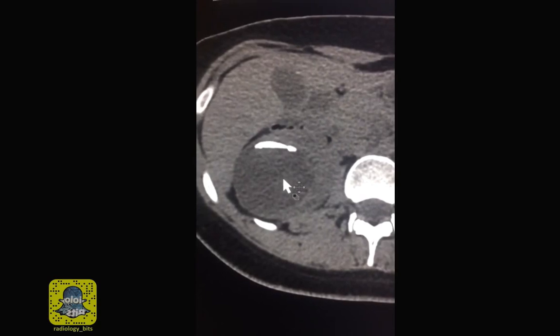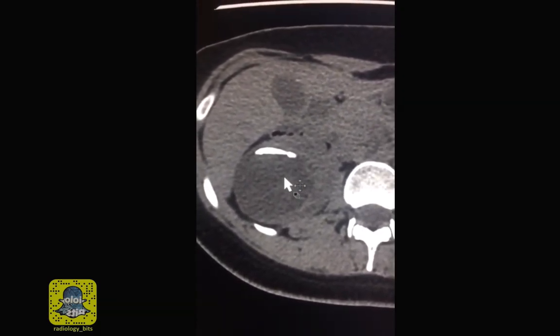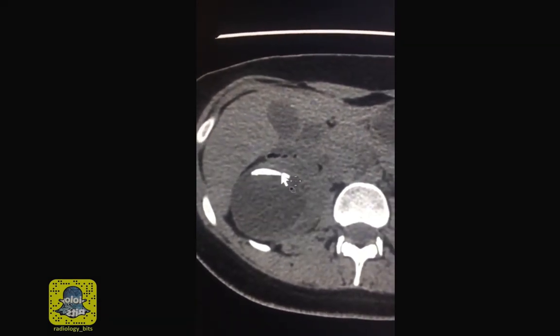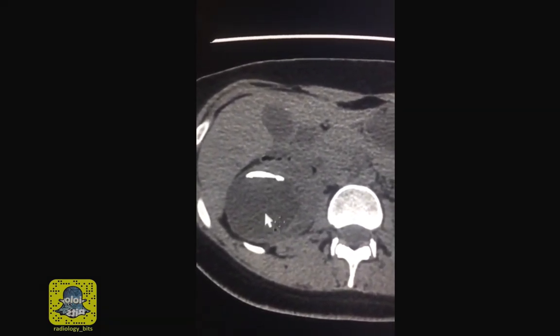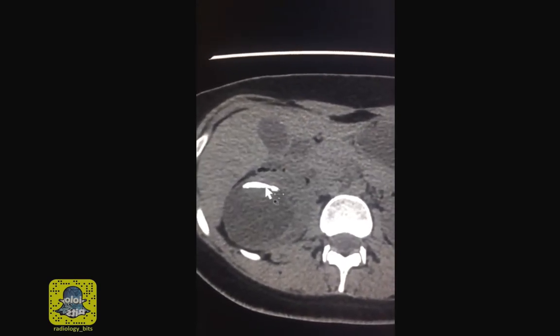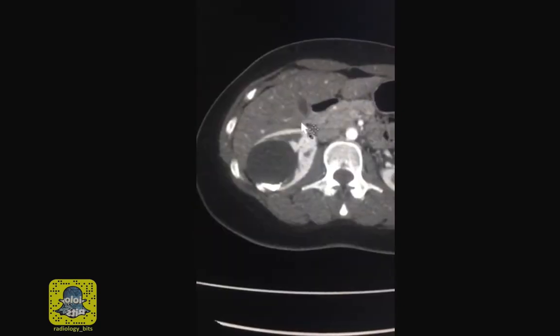On the previous CT that we saw that was performed with the intravenous contrast, the patient was supine in the opposite direction. And the calcium in that case was away from the liver. It was more posteriorly, while here it's anterior. So most of the calcium moved to go to the dependent location with gravity.